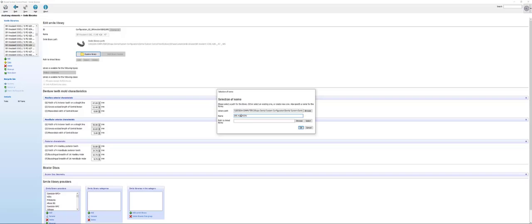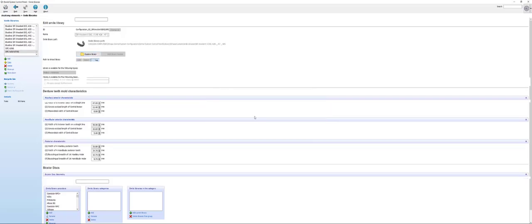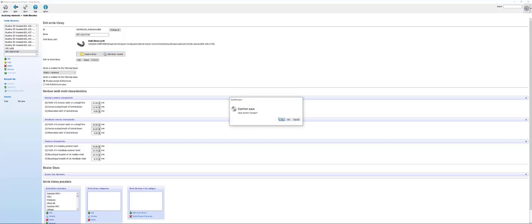Once I click OK, it's going to give me a warning telling me that I have teeth missing. Just click Yes. Because this is a copy of the original, which is only available in the denture module, only full denture cases is still selected. I'm going to click on the All Cases Except Full Dentures to be able to unlock this for my partial module. Once done, I will exit out.